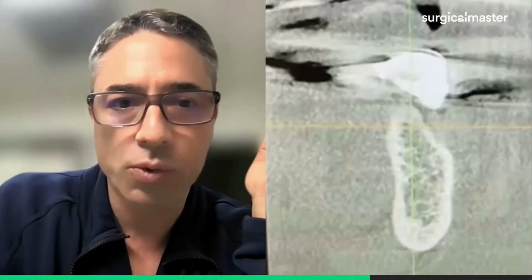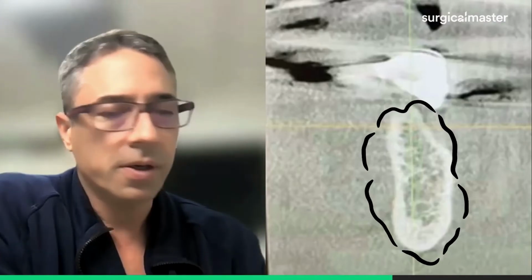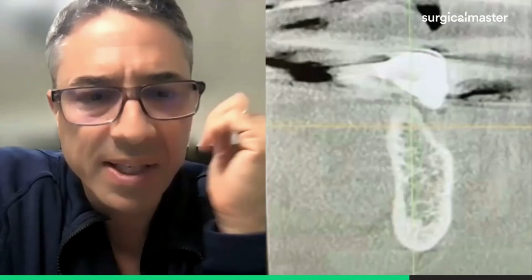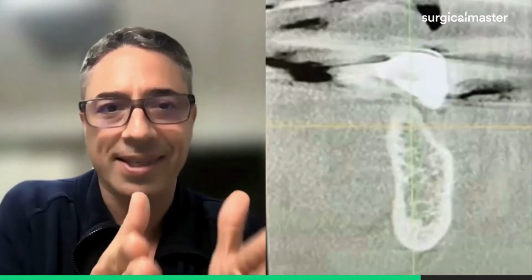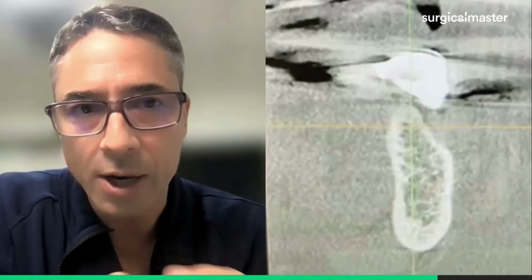Where's the ideal implant position? Because we may be able to skip that resorbed ridge. Here, look at the ridge here. This ridge is going to be hard to place an implant. It's thin. I'm not saying you cannot graft it. So you'd want a really thin implant, which is not very good here because you're going to have a cantilever. Or you can, the nerve is in a low position. You see, I'm losing the context of which pontic is this one. Is this the premolar? Is it 30? Is it 20 pontic, which I think it is, or is it 19? I don't have the.